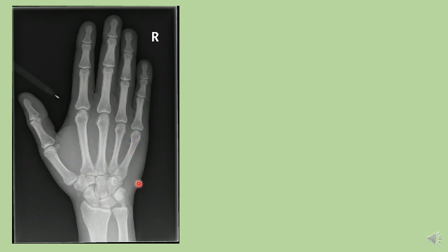You need not diagnose any defects. Just read and identify normal anatomy. When we look at the bones, this is the radius, this is the styloid process of the radius, this is the styloid process of the ulna. These are the next questions which you might have to answer, which examiners pick for you.